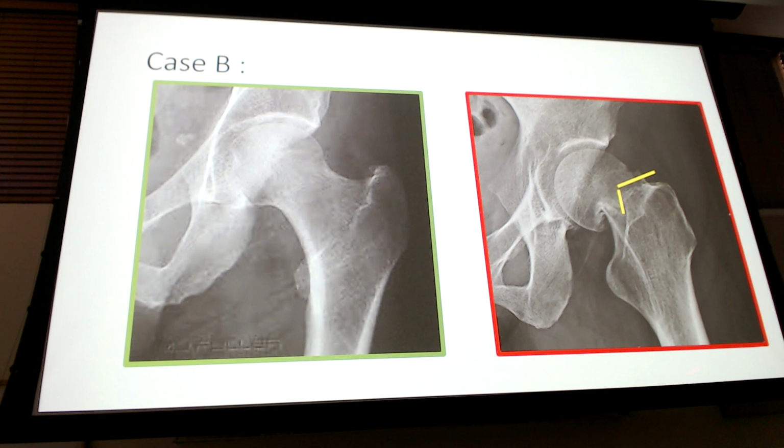There's the normal that's showing you there, the break there, and the break there. We already kind of went over this x-ray. Okay? Femoral neck fracture. Why do you think the palpation was normal? Like I said, palpation normal. It's deep, right? There's a lot of muscle here. It's hard to actually press down on the femoral neck when you're just doing your standard palpation you do on physical exam. So it's not uncommon for this to be normal palpation because really what are you palpating?